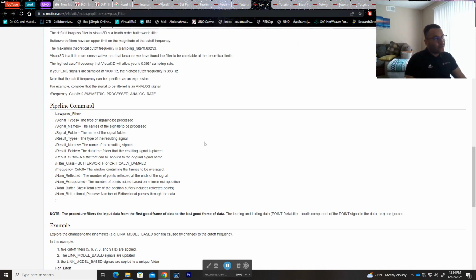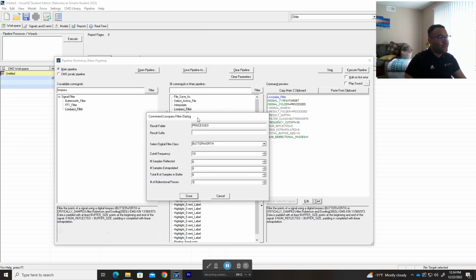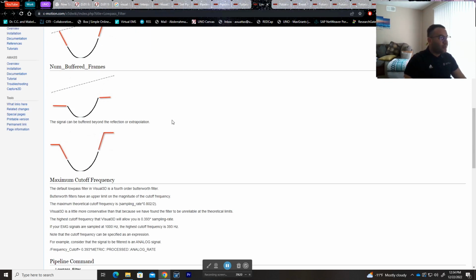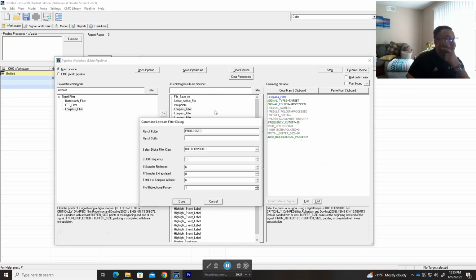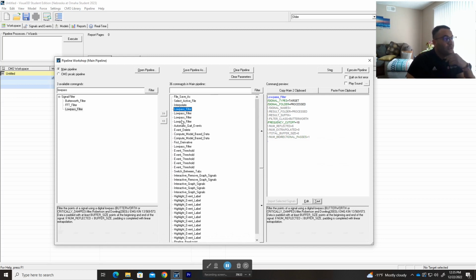If you don't know that, you should know that. If you don't, then you should be taking advanced biomechanics, undergrad biomechanics if you're an undergrad student, or advanced biomechanics. Or you can just do more reading. Like I said, here it tells you a good amount of information, but if you want to dig deeper, you just read more papers specifically about data conditioning in biomechanics. Alright, so this is what I like to do.